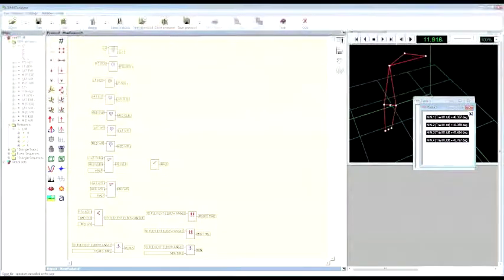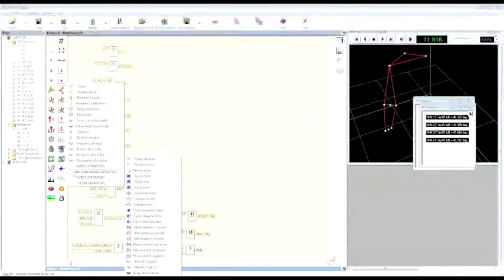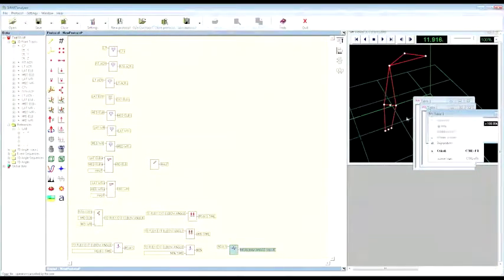To do that, I can click here, select the mean operator and select the sequence mean operator. The first output will be the mean max angle value, and the input is the peaks, and this is the result.